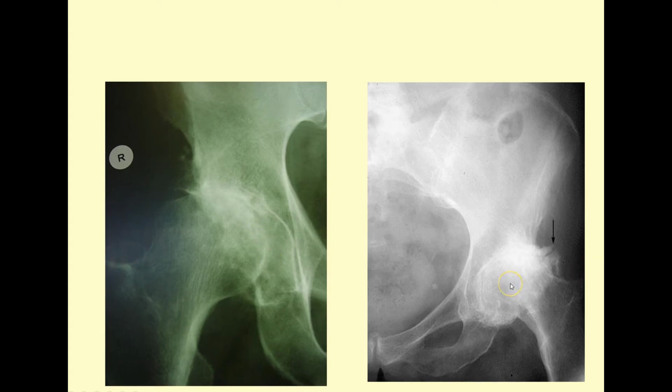Another example of a pretty thorough DJD scenario, large osteophytes on both the acetabular side as well as the femur head side, starting to see some of the buttressing that was mentioned, and we certainly have lost the round shape of the femur head here. And again, decreased joint space, subchondral sclerosis, bony hypertrophy or marginal osteophytes, and I don't see clear evidence of subchondral cyst here. I believe we've got a cyst here and a cyst here. So the subchondral cysts are sometimes seen. The other 3 things happen more or less in that order.